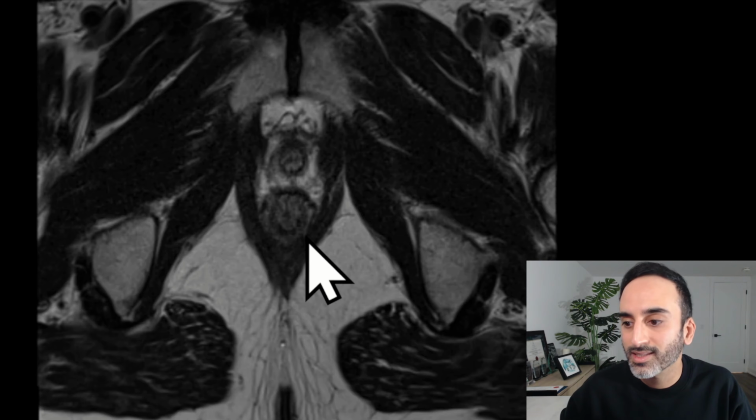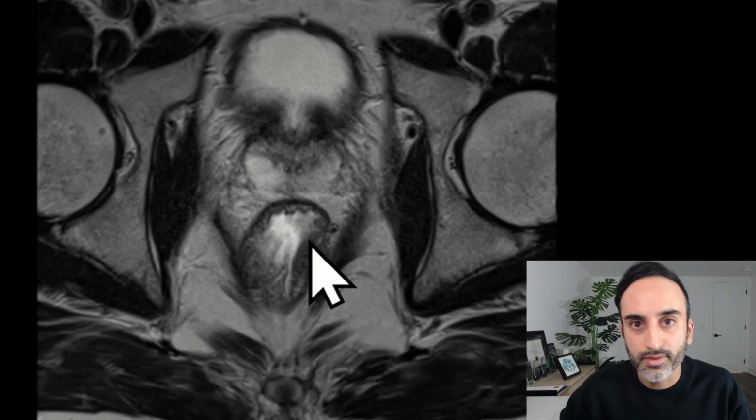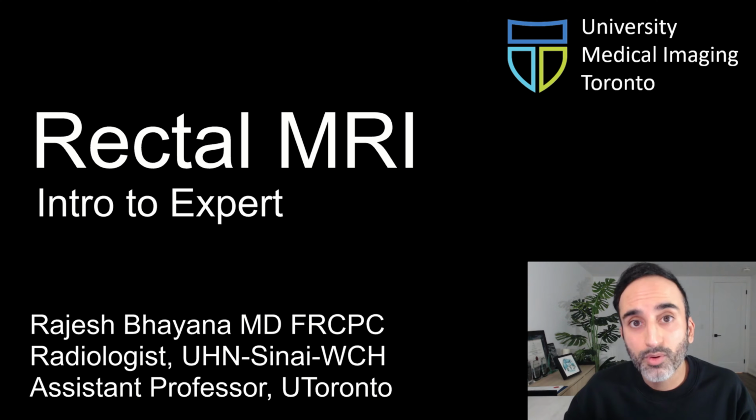So we're going to look at this case in more detail at the end of this talk, but first I want to cover some basics. This video is part of an interactive course designed to teach you how to read rectal MRI with a focus on staging rectal cancers, taking you from intro to expert level. You'll be able to scroll through MRIs representative of the most important pathologies and stages and learn everything you need to know to become a more effective radiologist.